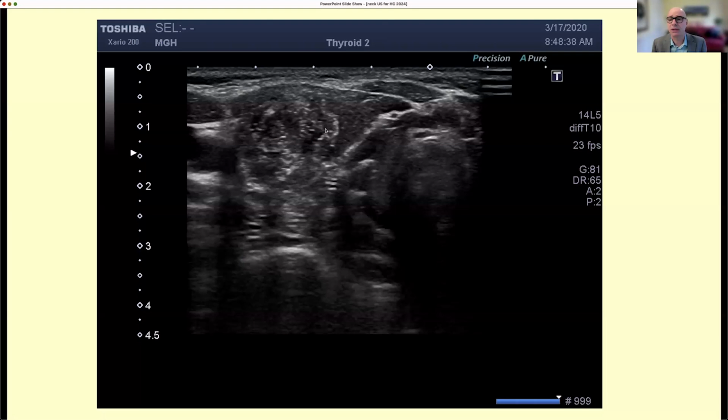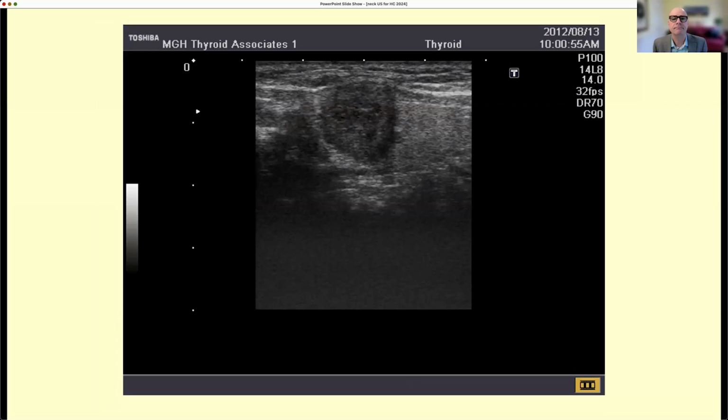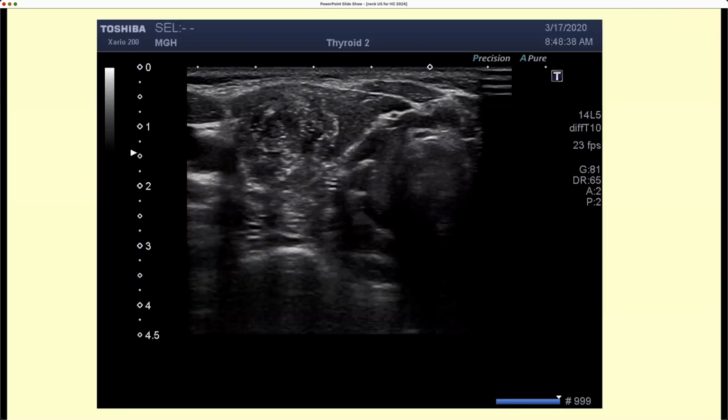And although here it is really hard to make up your mind, you don't see a nodule and you see a lot of bright reflectors. So you have to be very, very concerned about this and the potential for it being a malignant nodule. So do they present as a palpable hard nodule? Yes. Well, it may feel like a nodule, but usually the whole lobe is enlarged, but very hard. Thank you.